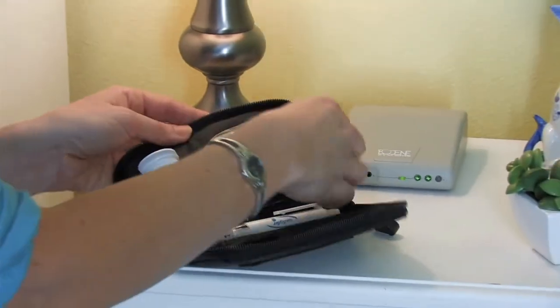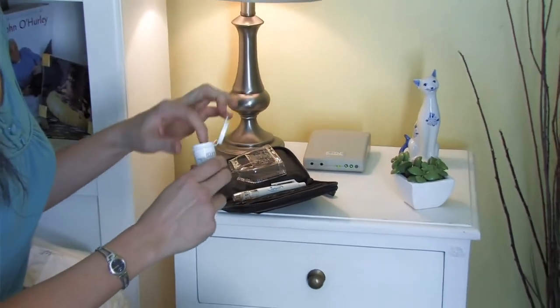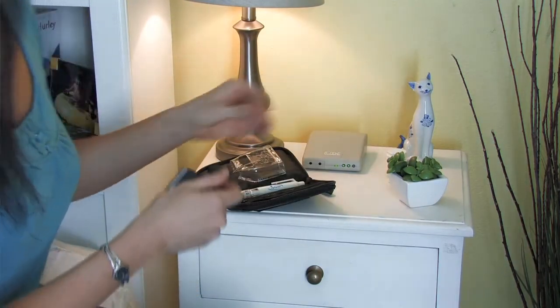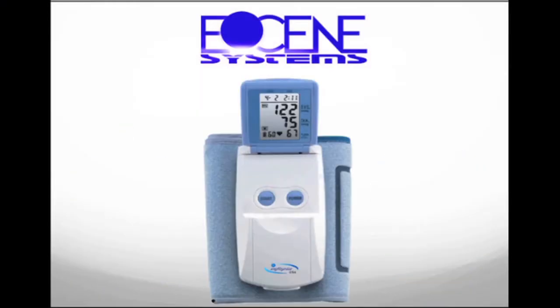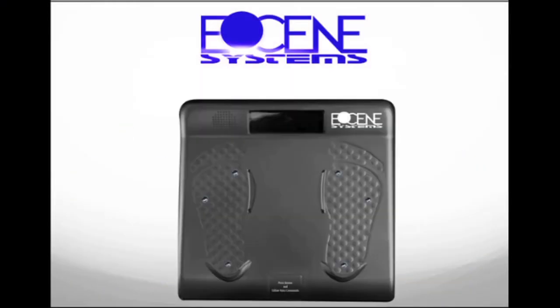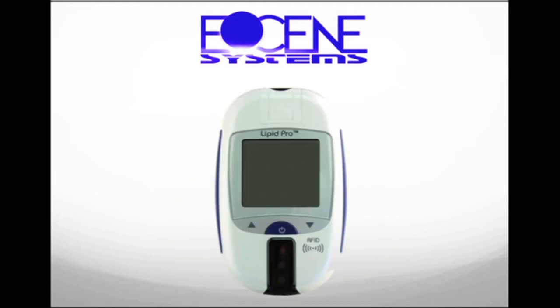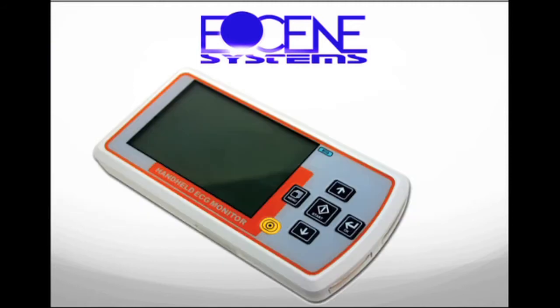The Eocene System is a remote home patient monitoring platform designed for the management of chronic conditions. The user interface we are about to explore contains real-time testing data that can be viewed by population or per patient. Our system works with a complete line of products including glucose monitors, blood pressure cuffs, weight scales, point-of-care HbA1c measuring systems, cholesterol monitors, pulse oximeters, ECG monitors, and more.